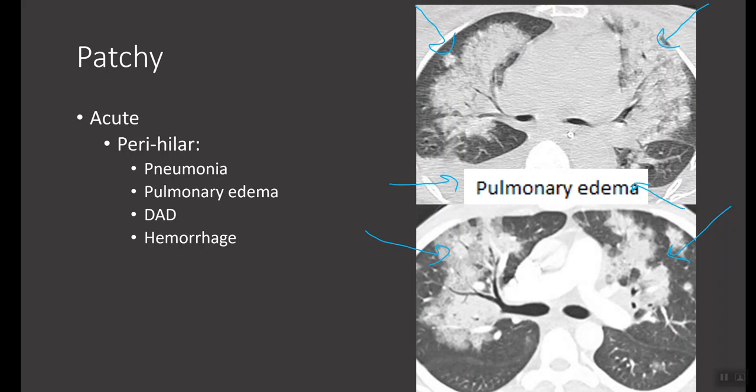The consolidated pattern of pulmonary edema more typically occurs not in people with congestive heart failure, but usually in people going through rapid heart failure, rapid volume overload. So people in acute renal failure, rapid volume resuscitation, non-cardiogenic pulmonary edema. Those patterns of pulmonary edema can produce this kind of perihilar batwing pattern of consolidation that we're seeing.